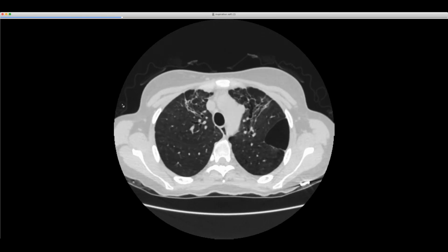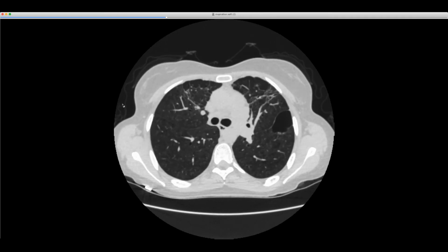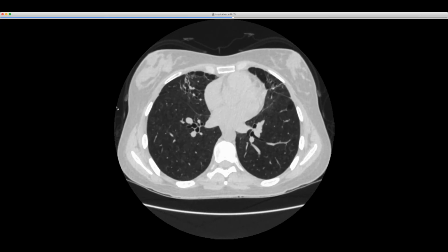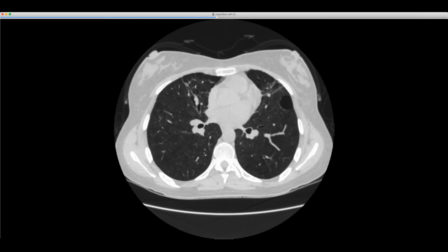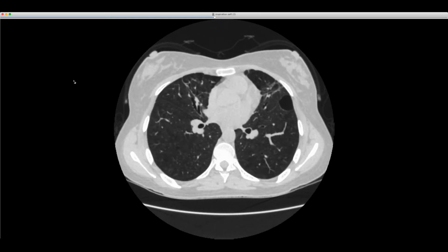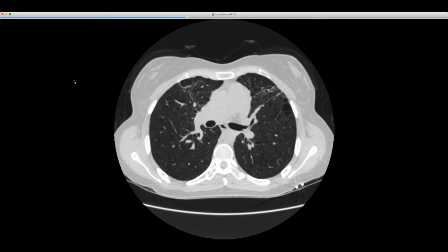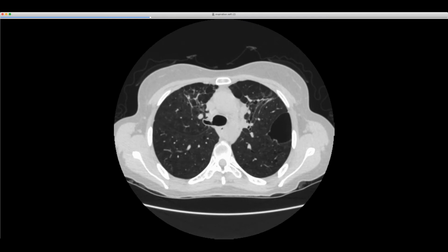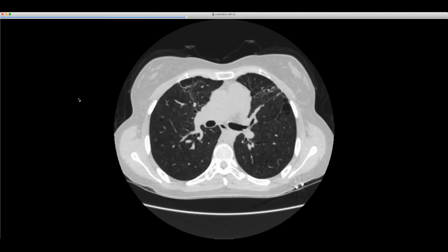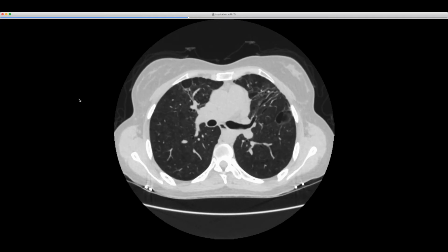And I have to say that this is probably the most textbook case that I've seen so far of this anterior predominant fibrosis, presumably due to the barotrauma that the dependent consolidation protects against in the setting of prolonged intubation. But I just thought that was a beautiful case of anterior predominant bronchiectasis and fibrosis in the setting of ARDS due to influenza pneumonia.